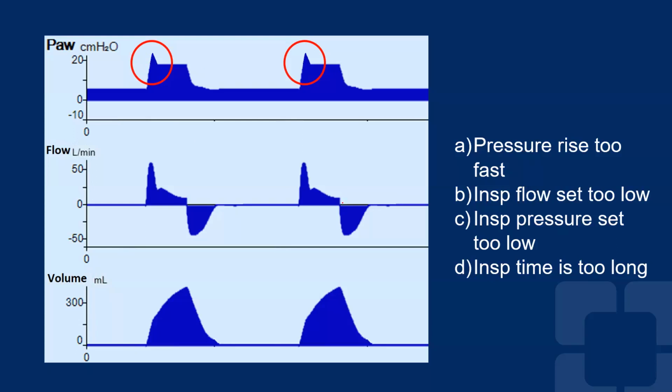Volume times elastance will give you what we call the elastic load. And flow times resistance will give you the resistive load. Now, if you agree with that, at the beginning of the breath, just at the moment when we pressurize the system, what the ventilator is seeing is a high peak flow, and the flow is hitting immediately the resistance. The lung has no volume in it, or a minimal amount of new volume.